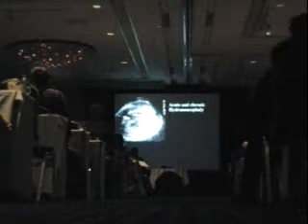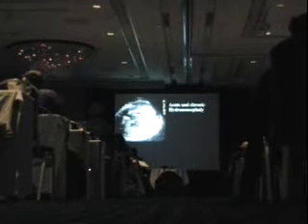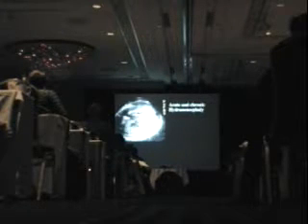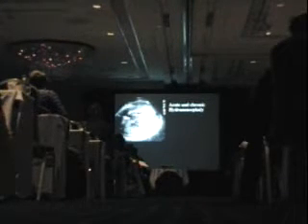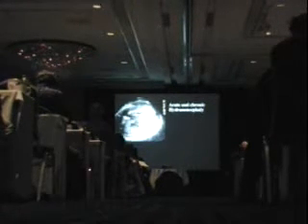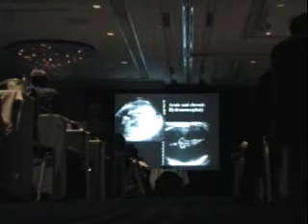And this is actually one of the most interesting cases I've ever seen. This goes back a long, long time now. This patient came in just for a routine sizing, and the entire brain was bright. The entire thing was bright, except for the thalami. And we didn't know what we were dealing with. Turns out that this was hydranencephaly. The patient came back a few weeks later, and the entire brain was liquefied.